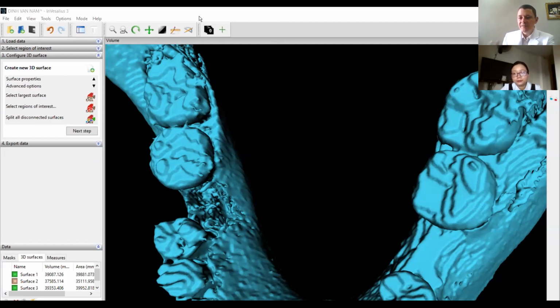And even on a CBCT, in fact, it's not so easy to see because it will depend on the angle of the cut. Okay, if I cut like this, I can have the impression that I have space. But if I cut like this, I will see I cannot move.